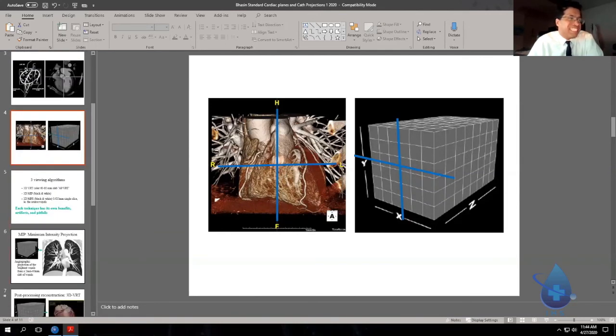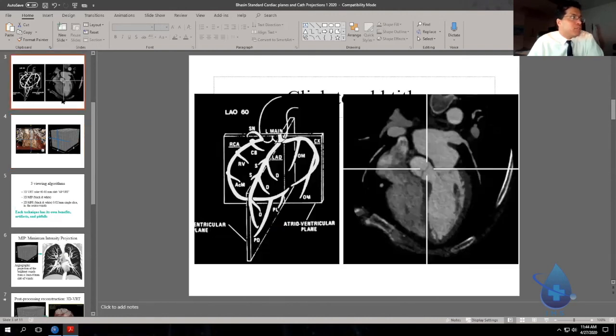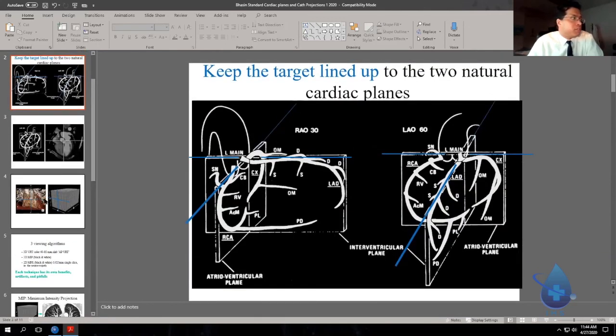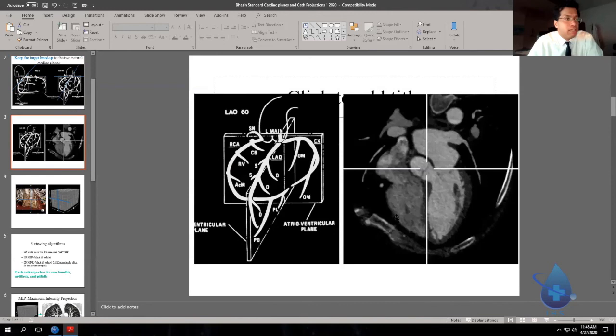It takes a little more effort at first, but once you do, it opens up the entire thorax to a cardiologist, because you can then look at an echo and turn your eye right over and look at the four-chamber view on a CT without even blinking an eye.